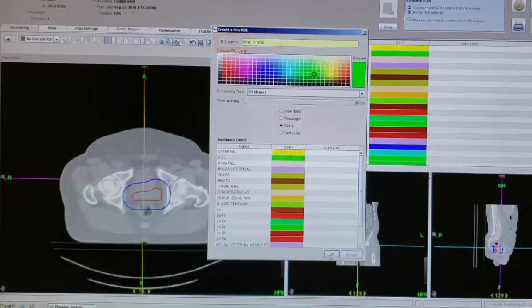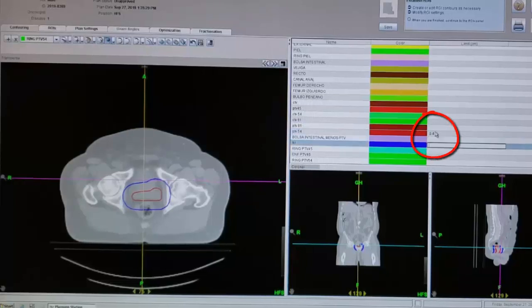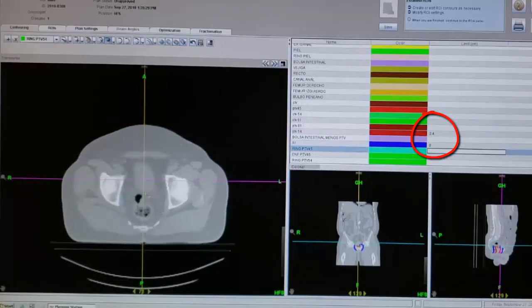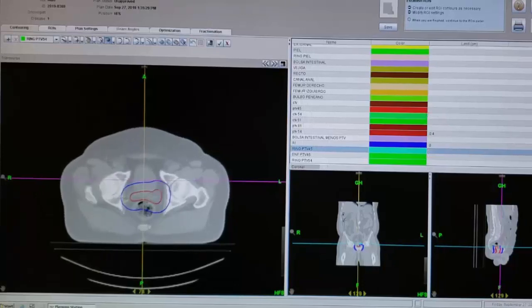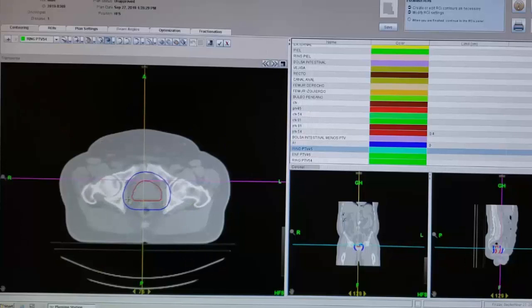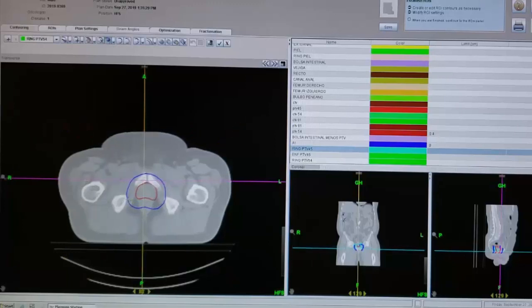That structure will be 0.4 centimeters out of the PTV54, and it will be attached with auxiliary A1. We initiate the contouring process with each and every slice. Evidently, each structure becomes shorter and it makes it easier to contour.